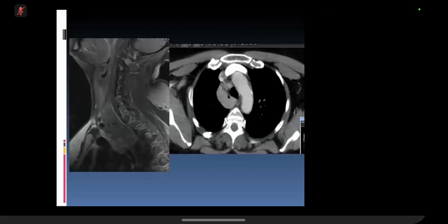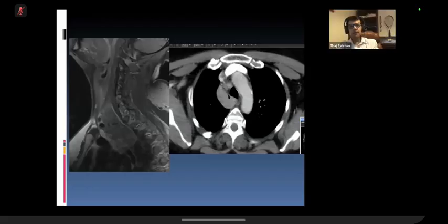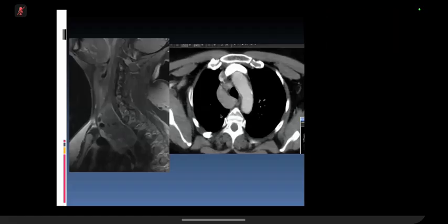It's in the epicenter is in the posterior mediastinum, but then mediastinal tumors don't know that we have divided them into compartments, so they grow everywhere. So primarily a posterior mediastinal lesion going into the middle mediastinum, as you can see on MRI and CT. Diagnosis?